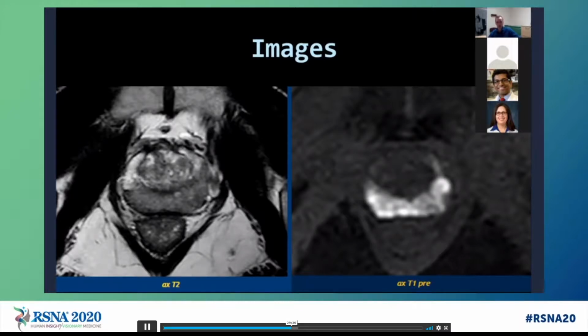There is some data from a few years ago from a series that they did in London at UCL, where they imaged patients before biopsy and then at different intervals, 3 monthly up to a year post biopsy. And in individuals, the hemorrhage on T1 can persist for a number of months. But even when that's dissipated, you still can see some residual changes on the T2.